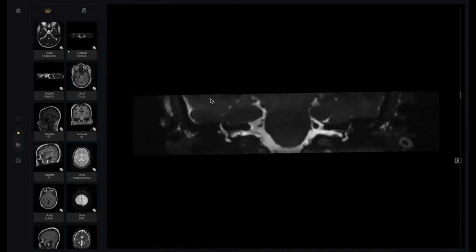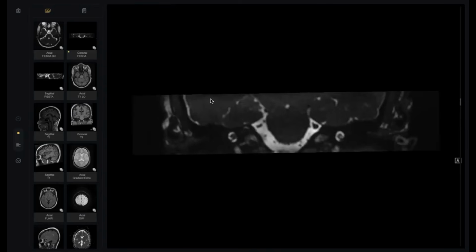Here, what happened? This image is very easy and very difficult at the same time. Why? Because it is concentrated here. If you know or if you guess this is the trigeminal, you will take the full mark in this case. But if you are confused, you will lose it completely. That is why I bring this case.